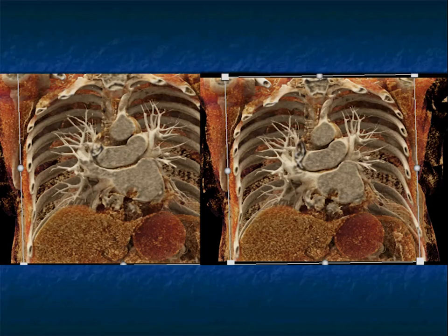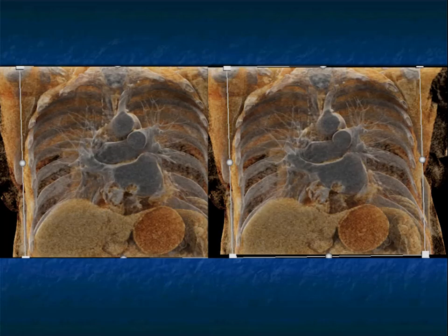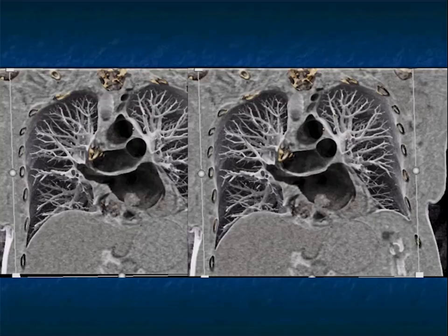And here it is very nicely on the cinematic rendering. We have been doing some cinematics on these patients. It's a good way of looking inside the chamber when you do black blood images, as you can see here. So that's a very nice way of thinking about atrial myxoma.